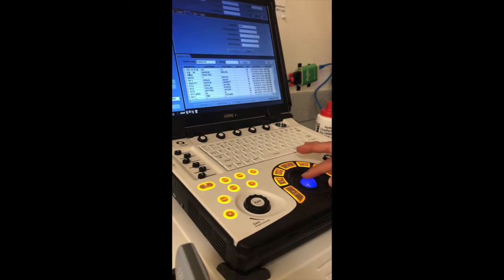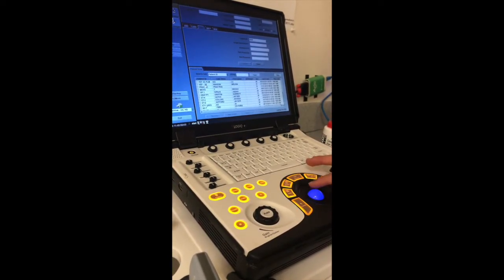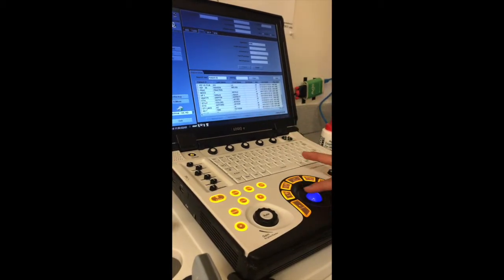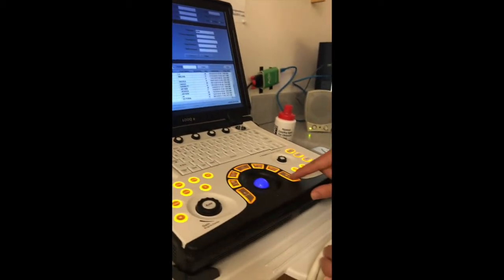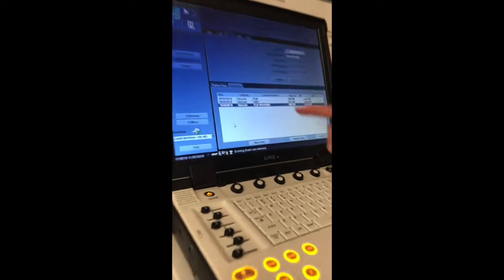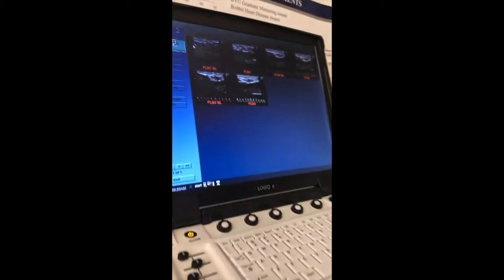The beginning should always be whatever the study name is, and then the end is the ID. So today, let's go to exercise training 4 right here. I'm going to double click on enter, and this pulls up the different options. So you can see PLM right here. I'm going to double click once again on PLM just because that's what I'm analyzing this time.